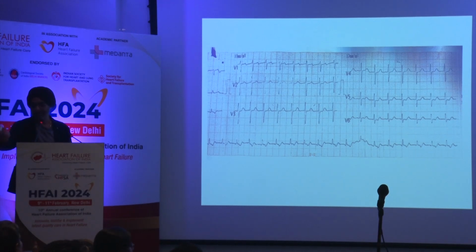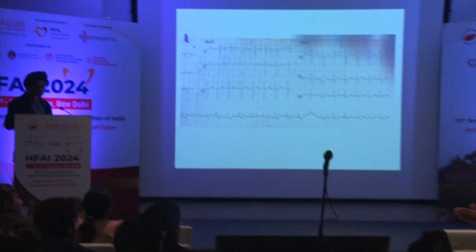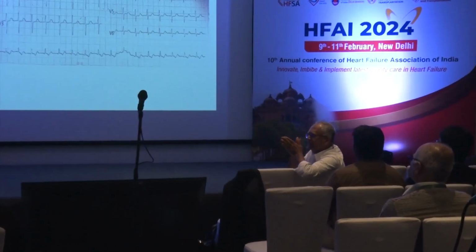Yeah, please come. Even if there is nothing, you say, is there a tachycardia? If there is a tachycardia, is it regular or irregular? And can you decide? Narasimha, take the mic. So is there a tachycardia? Rates are more than 100, there is a tachy. Is it regular or irregular? What is the relation of the P to the QRS? These are the three things you're just going to describe.